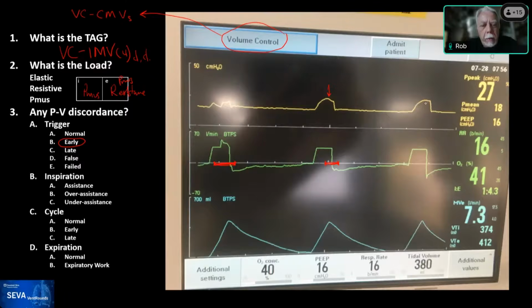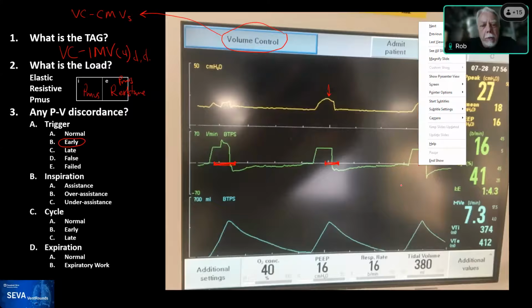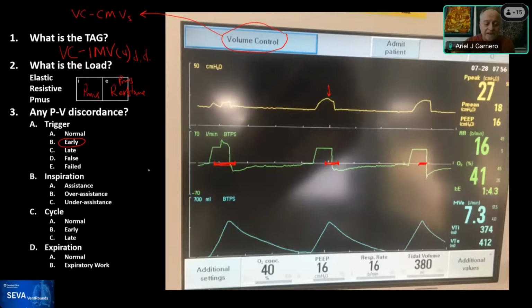Pressure has to rise. Can I say something? Yeah. I agree with you. It should be a straight line with the PIP way higher. So it seems like that part is scooped by the reverse trigger breath. Also, the contraction lasts longer and makes the peak expiratory flow lower compared to the third breath. So you're saying that it's like this amount? It should be. Yeah, that sounds reasonable to me too. Okay. And also the flow doesn't increase to 90 degrees, so we cannot observe the normal pressure waveform that we usually observe with the initial step.